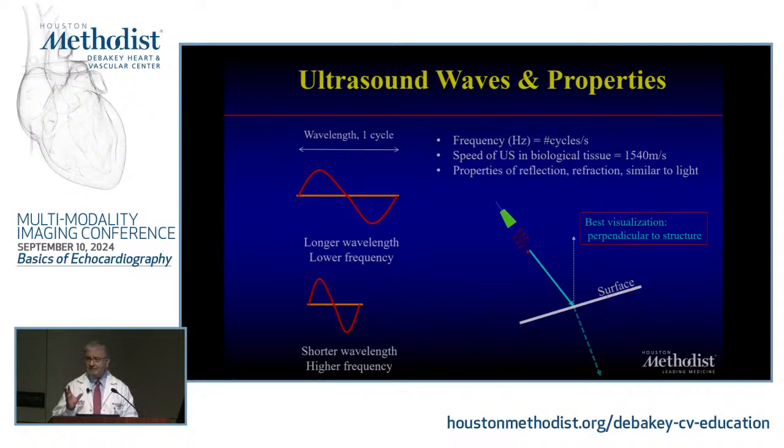So it's almost a miracle that we see so much of that interatrial septum. Most of the time you may see a dropout, but that doesn't mean it doesn't exist. It's further out, after the interventricular septum, in a parallel situation.